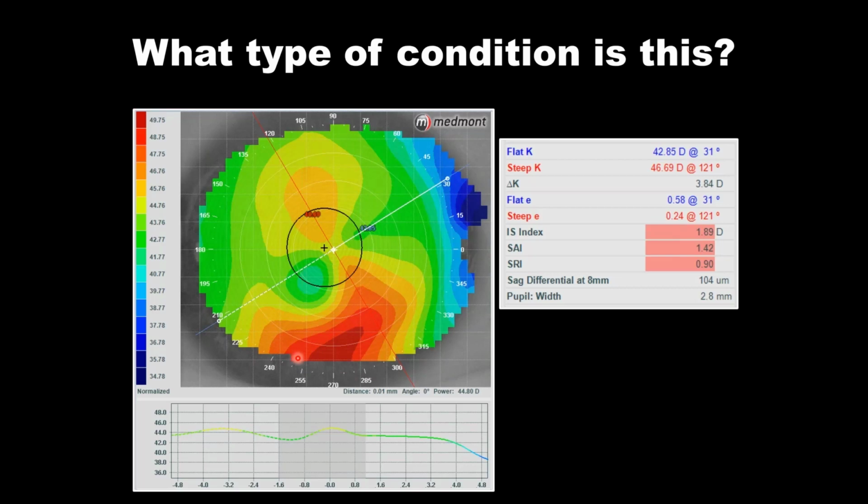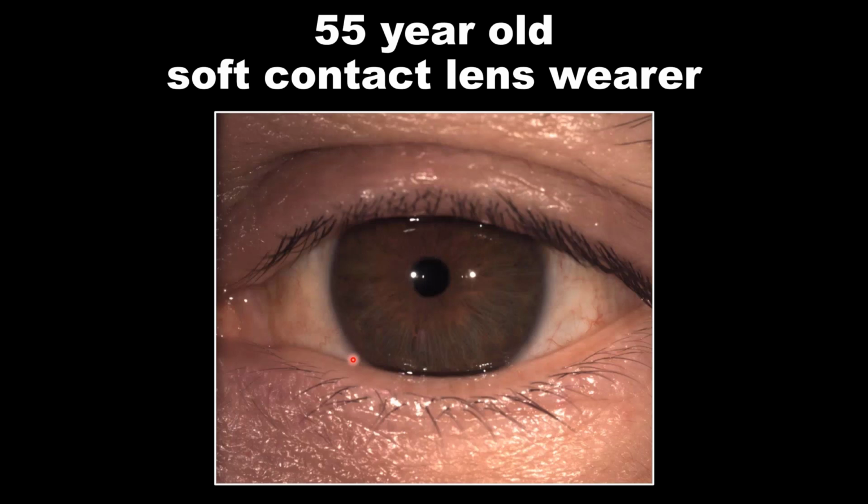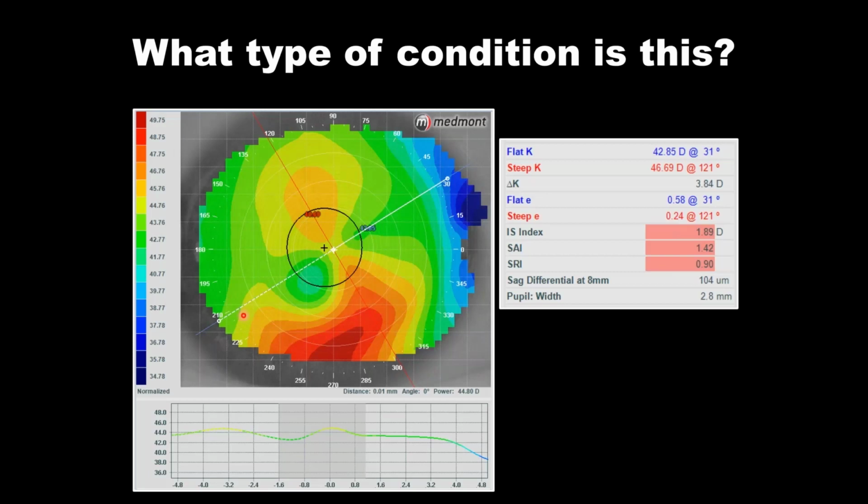Is that lid force constantly on the inferior cornea? When we look at this patient's fissure size, you notice the position of the upper and lower lid. Does this lid position create some pressure on the inferior cornea that's giving us this arc that you see here? Is the prism of the soft toric lens also creating extra pressure with that lid force? Is it an anomaly? Is this topographical error? Is it a tear wedge across the inferior cornea? So there's a lot of things that it could be, but it appears that there isn't a tear wedge.